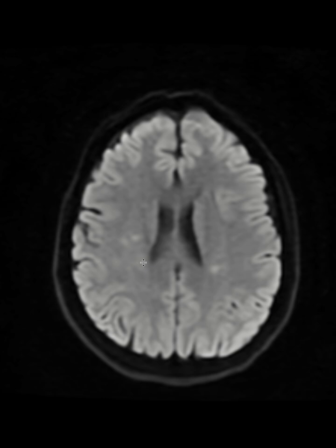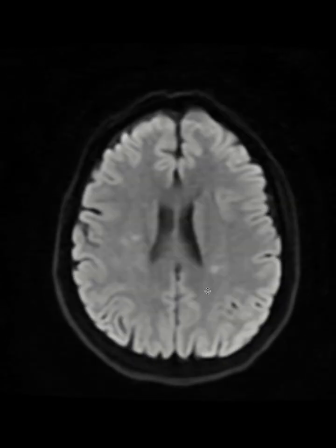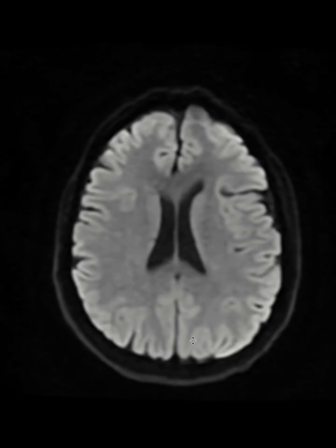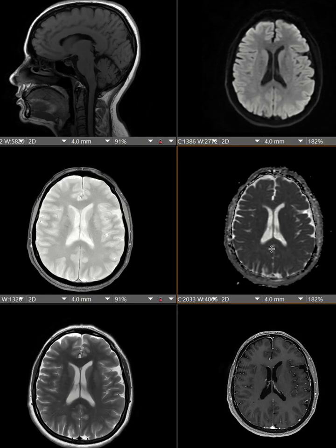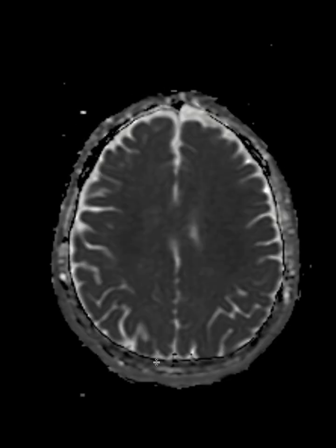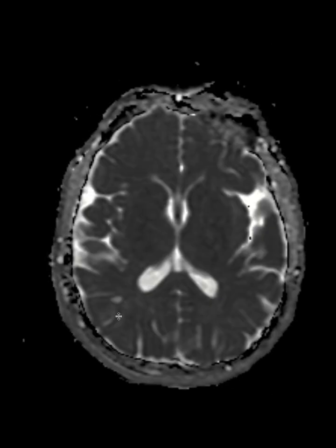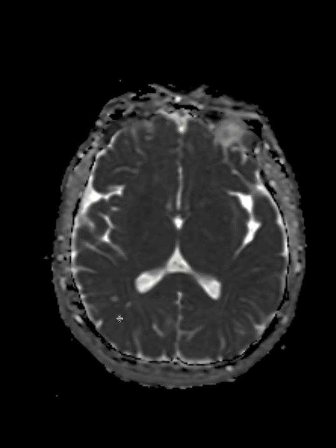When you look at this, we are looking for restricted diffusion. I see the lesions are bright. Those lesions that I showed you on sagittal T1, some of them are bright. But we cannot interpret DWI without the ADC map. When you look at the ADC map, we see that most of these lesions are bright on ADC. That means this is T2 shine through. It's not real restricted diffusion, and these lesions are chronic. There is no active process happening at this point, because these happened in the past, and now they are not showing restricted diffusion.